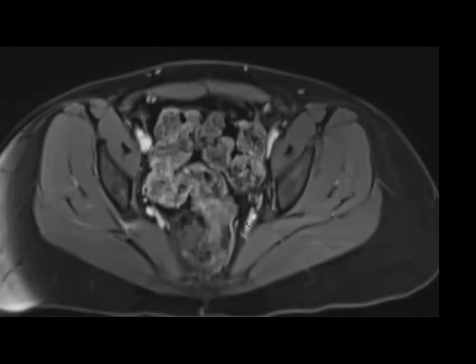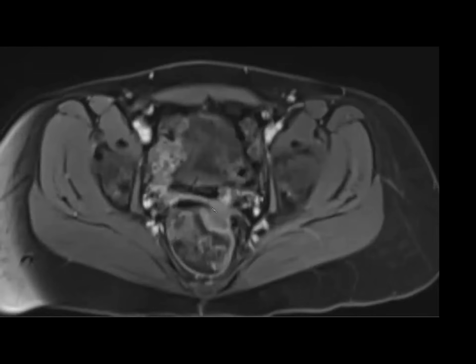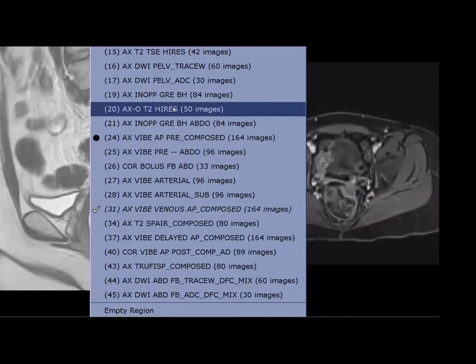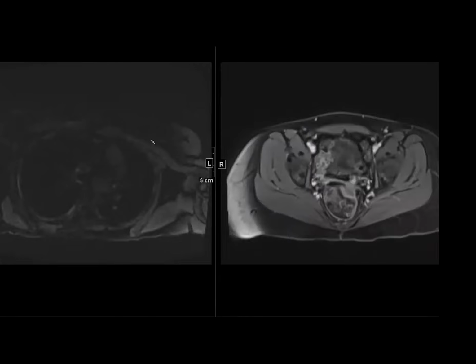Okay, so I'm going to show you a couple more. It was not endometriosis, but even here. What, really? Yeah. No, I know. This is like a totally. You think I'm just going to show you? Of course, Aarti would never show something as simple as that.